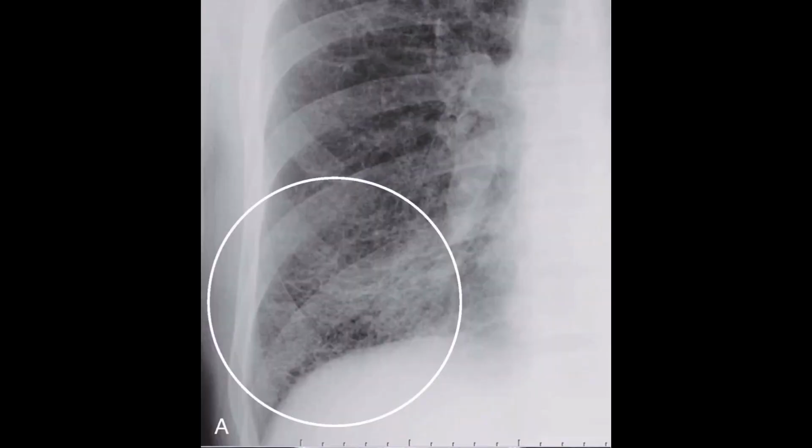So this is the appearance of interstitial pneumonia or atypical pneumonia: viral, or Legionella, mycoplasma or chlamydia. Or if this pattern is bilateral, think about PJP in an immunocompromised patient. And these reticular interstitial markings represent fibrosis. And this is like a close-up at the lung bases.